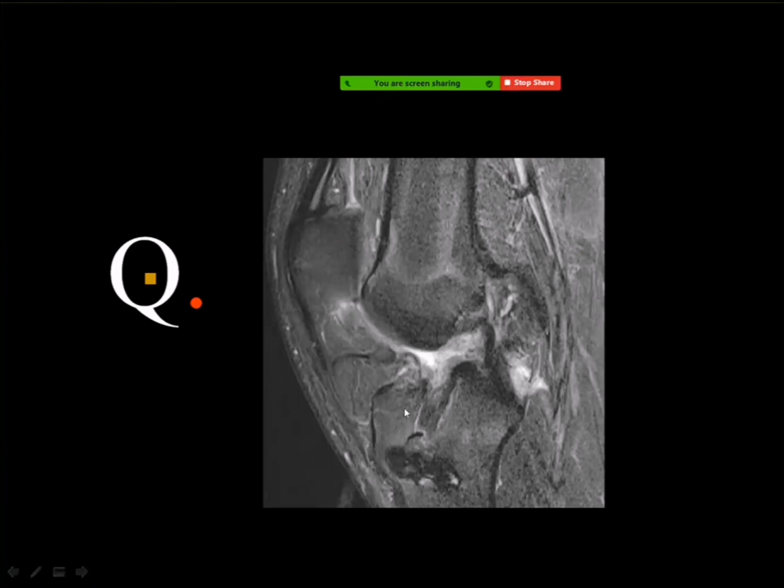Cyclops lesion is present here in this particular area in the anterior knee joint space. But where is the graft? Failed, yes. You see a graft here, which should be more or less similar to the posterior cruciate ligament, but the graft is not present. It is replaced by fluid. That's to say that the graft has failed.